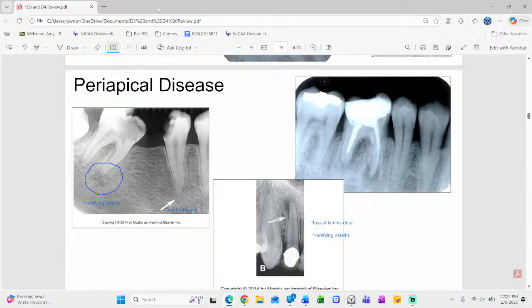They're not great along the sides of the tooth, but definitely you say, yep, I've had a previous endo-treated tooth. Whether this is new or old, we don't know. So whether it's still healing or this is 5 years past and now this is all new, that's objective and some subjective. Patient, you'll learn from patient information. Everybody good on periapical?